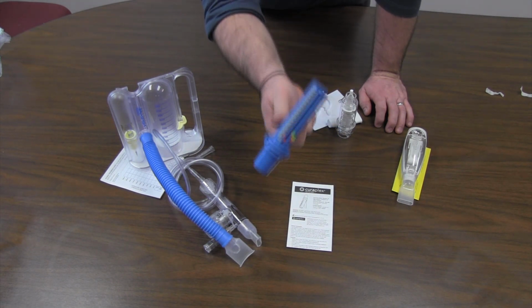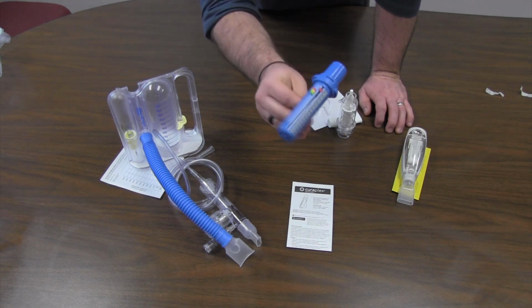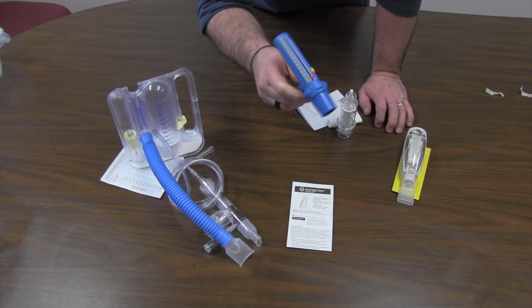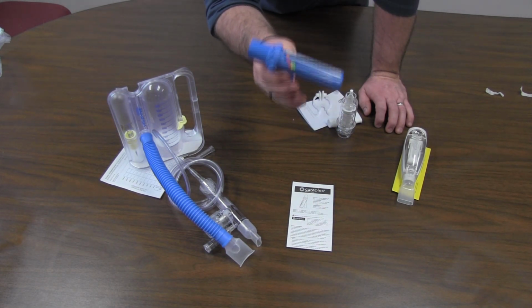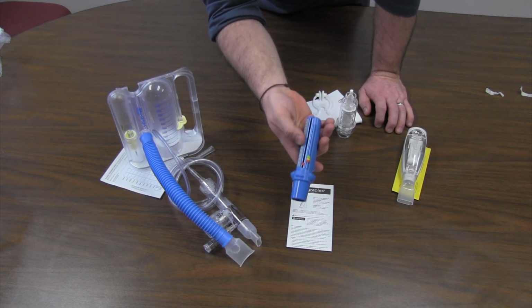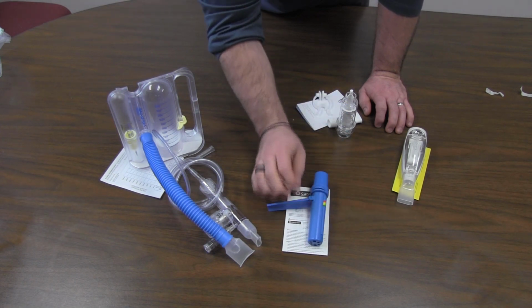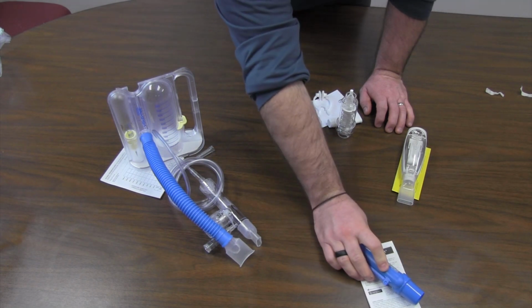All you're doing with this is monitoring airway resistance. In most cases, and in all cases, you're measuring your exacerbations of asthma. So how are your airways doing today if you have asthma? This is a monitoring tool. It has no therapeutic effect at all, but when used properly, it will be used as a guide to tell you where your flow rates are today and what medications you might need to assist. So, peak flow meter. This is a monitoring tool. So we'll put this dude way over here.